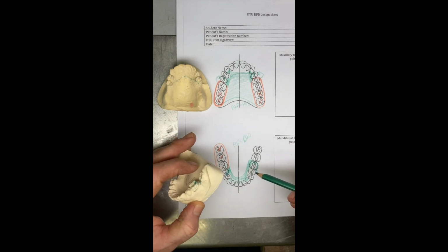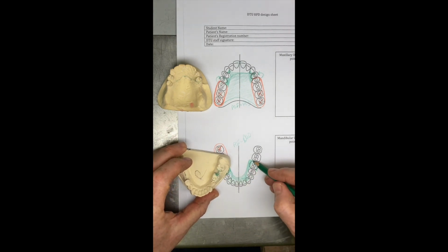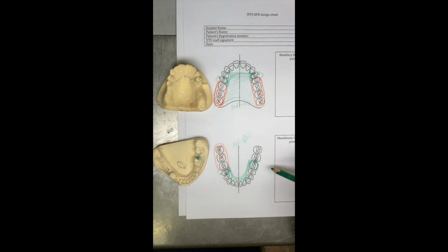Other things that you might want to consider then, this funny little gap, whether you want to bridge the gap with a bit of metalwork, so put a mesial rest on this distal tooth and make a little hat across, open underneath just to stop food packing down. That'd be a reasonable thing to do. If you're doing that, you might want to incorporate another clasp, but that's a reasonable design for this pattern of tooth loss.